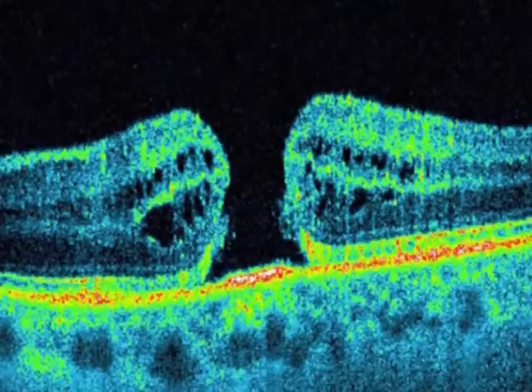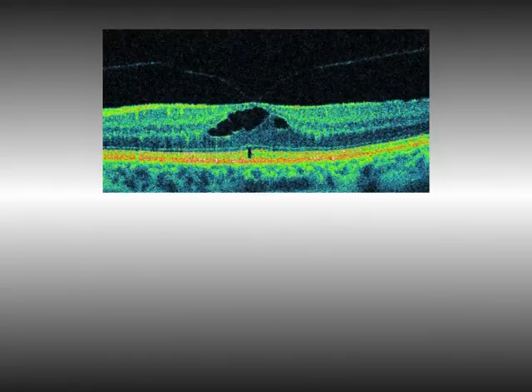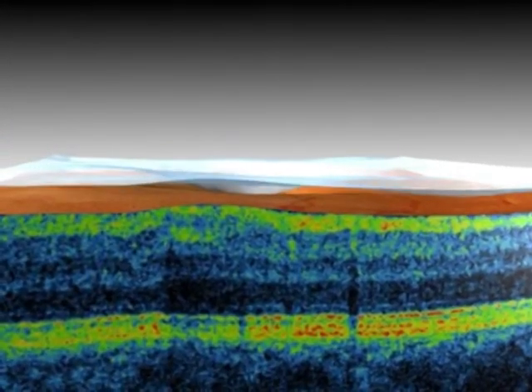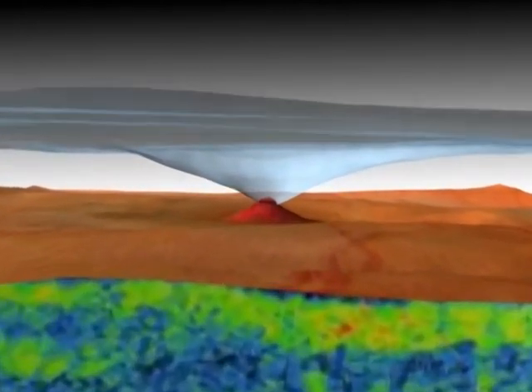This process is somehow different from full-thickness macular hole formation, where traction on the fovea is much wider and creates fovea elevation as an initial step. To summarize these events, we have created an animation presenting their sequence in the process of formation of non-full thickness macular defect.